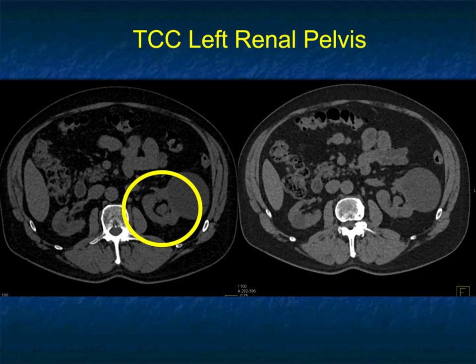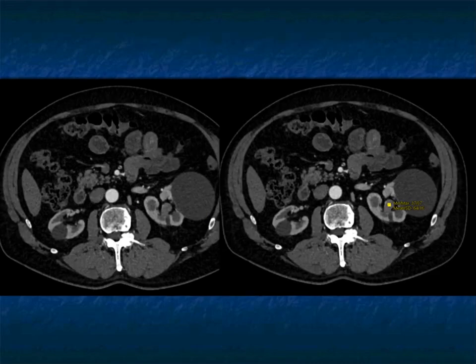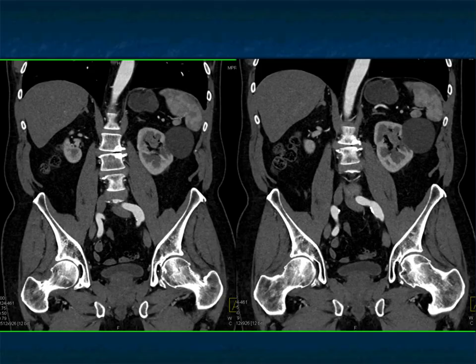Another patient, left side, big cyst. Maybe you pay attention to the cyst. Are you paying attention to the pelvis? Maybe I'm just making something up here. I don't know. But there it is. It's enhancing all the way to 64 when you look at the early phase imaging. What is it? Could it be a high-density cyst? Well, there it is on the coronal view. It's some soft tissue filling defect by the upper pole calyceal region.